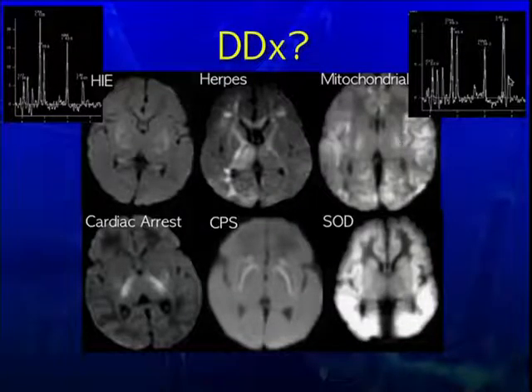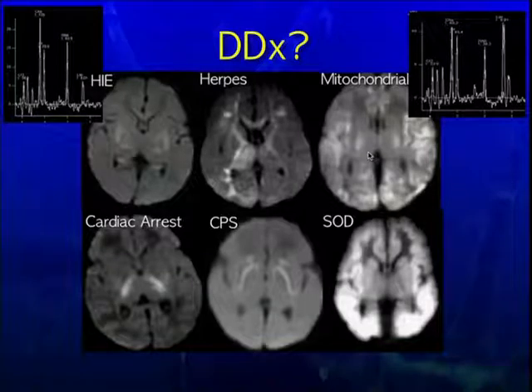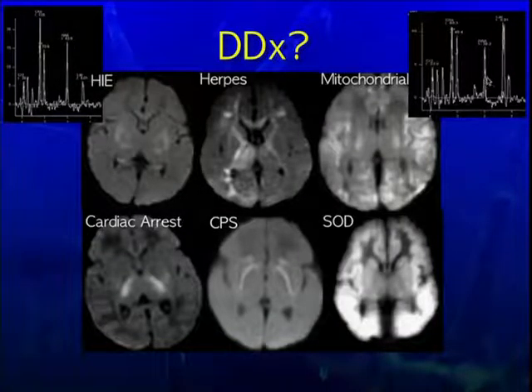What is helpful here is this massive lactate peak. When I see a massive lactate peak in a pattern that's similar to hypoxic ischemic injury, you think about vulnerability. Maybe this child had a pre-existing vulnerability and, though having very bad Apgars and presenting exactly like HIE, had an underlying diagnosis. So think about that when you have a pattern that fits with HIE, but no prenatal history that leads up to it, and a very large lactate peak.